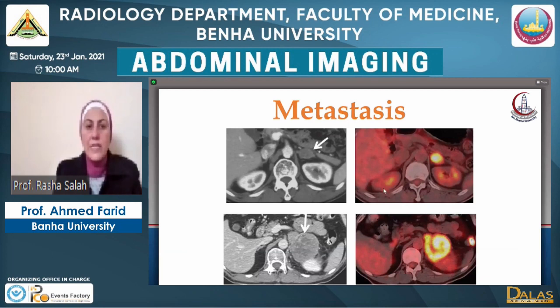On the PET-CT, adrenal metastases usually have significant FDG uptake, and these are two examples for two patients with small left adrenal metastasis showing avid FDG uptake, and this is a larger adrenal mass with also avid uptake.